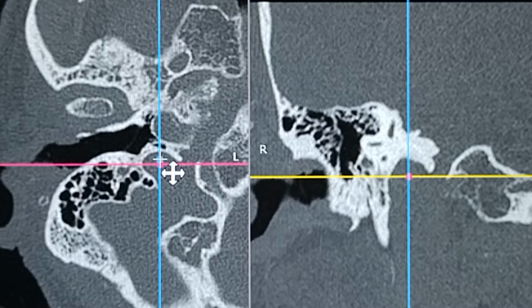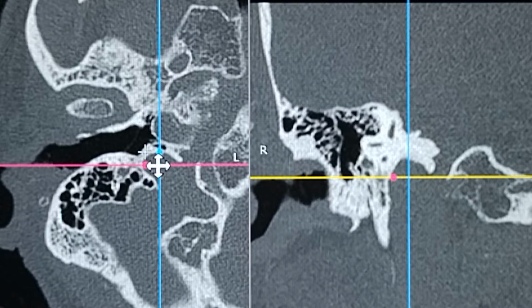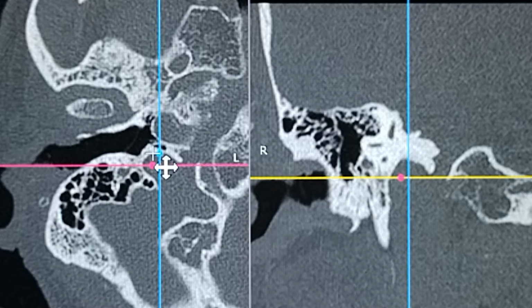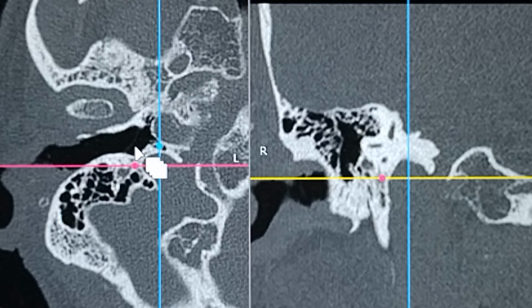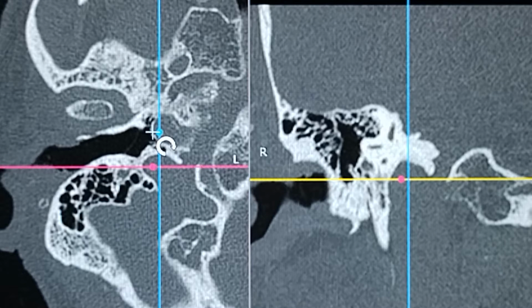Now the clinical importance of this jugular bulb is that in this patient, you can see a thick bone covering the jugular bulb. That's the jugular fossa. Basically that's the thick bone. If at all in a CT scan you see that this bone is dehiscent or very much thinned out, sometimes a diverticulum comes outside. Similarly, you can see this is the carotid artery, and that's the bony covering. Sometimes this carotid artery bony covering could be dehiscent, and a diverticulum of the artery can be coming out.